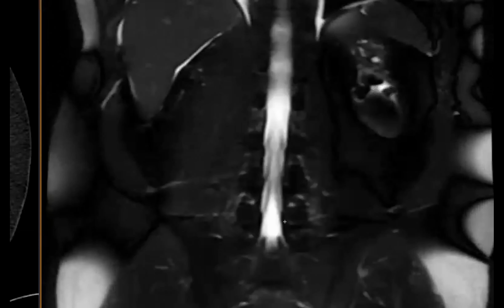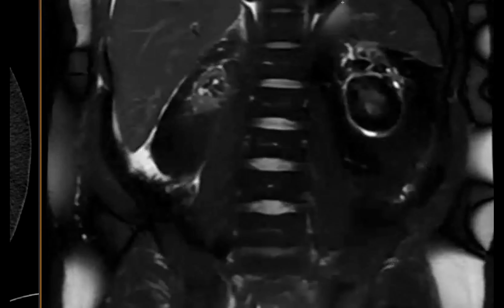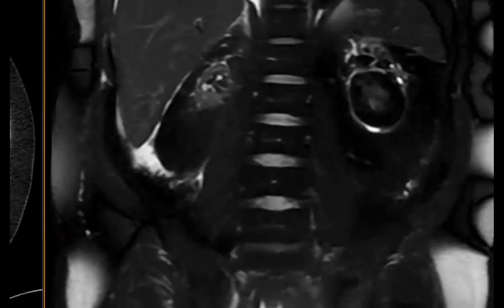And here we have, I'm going to run through the T2 coronal first. And you can blurt out your thoughts as we run through this, focusing on the left kidney. There is a transplant kidney in the right lower quadrant. The native kidneys are severely atrophic. At this point, the patient didn't receive contrast, and so this was only a non-contrast MR.